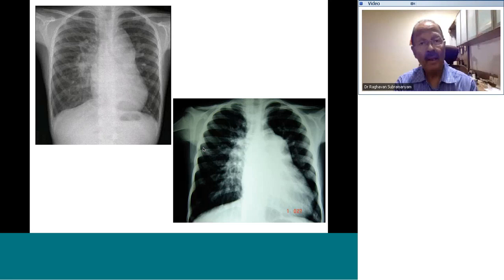On the other hand, look at this X-ray. You have a large left to right shunt, very large vessels, multiple end-on vessels. In fact, you can see very indistinct hazy vessels. Therefore, a very large plethoric lung, very large shunt lung. Along with that, some interstitial edema because it must be a child. Now, the pulmonary artery is big, but along with that, the aorta is also big. Can you see that the entire left upper cardiac border is big with a very plethoric lung?